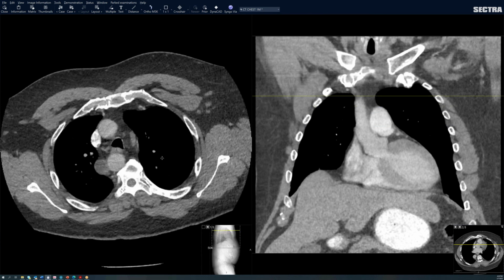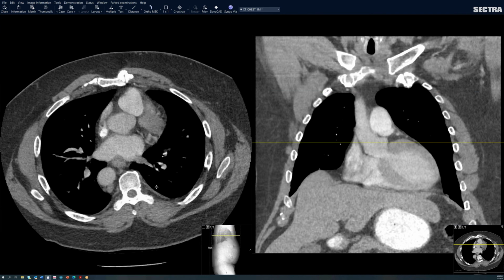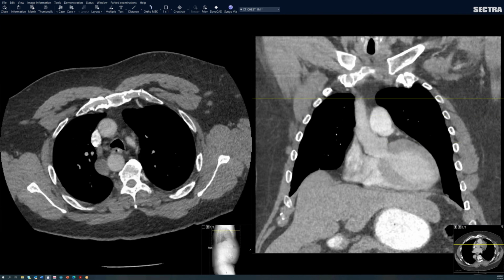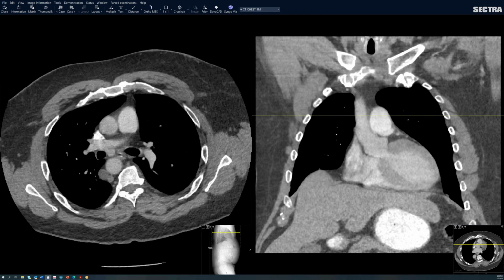Is it a crisscross pulmonary artery? So why do you say it's crisscross, Aus? Well, so it looks like there's a kink. It is crisscross pulmonary arteries, which is exactly what I was showing. But it would be great if you can talk about why you said crisscross pulmonary arteries for the benefit of everyone else.